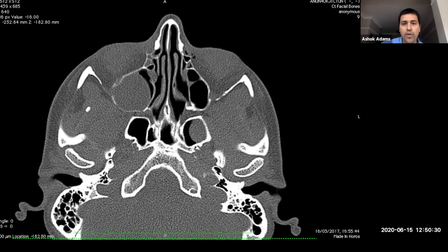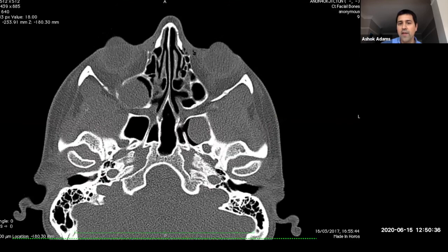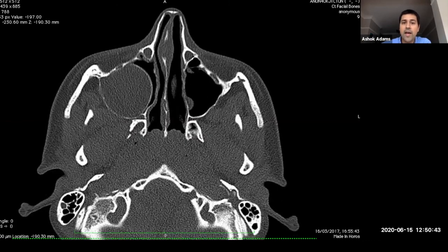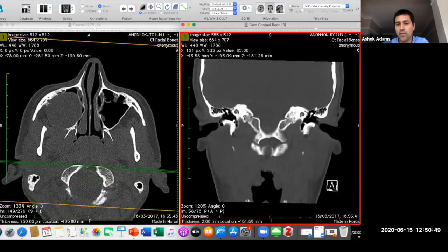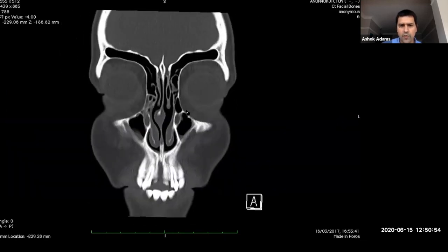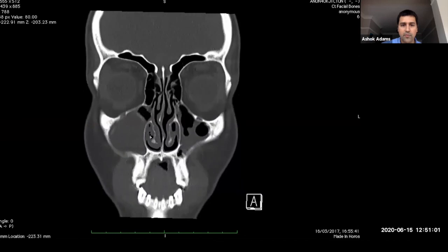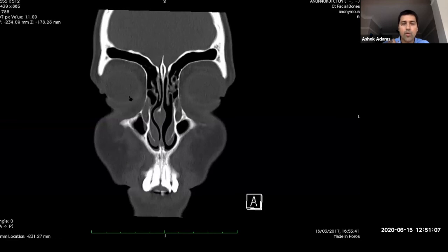And in East London, we see a lot of trauma. Particularly when I see craniofacial trauma, if I see a fracture line that runs through the nasolacrimal duct, which you can see there, I will typically comment on it. Sometimes the patient will develop scarring and present a few months down the line with epiphora, so I'll always comment on whether I think that's involved. It's probably easier for you guys to see on a coronal view. Go anterior to the orbit, there's the nasolacrimal canal, and then you can see how it opens up to that inferior meatus.